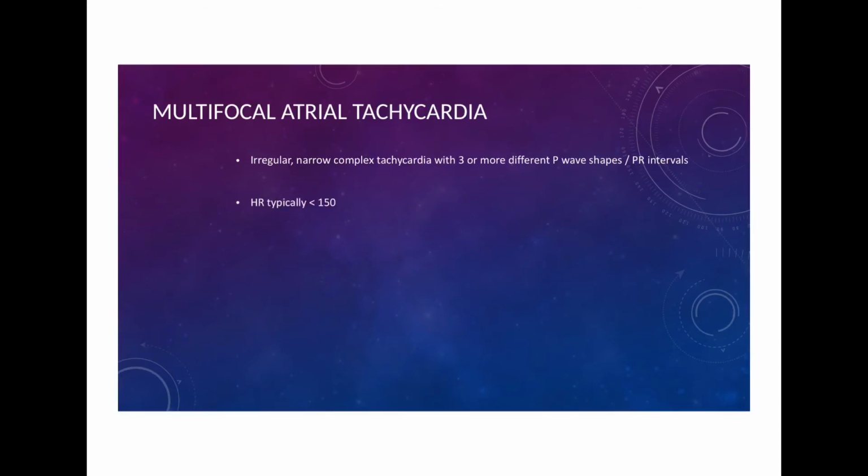Now there's multifocal atrial tachycardia, which, in addition to variable flutter and atrial fibrillation, is the other possible differential for an irregular rhythm. The key to identifying it is you're going to look for clear P waves, but they're going to have different morphologies alternating with each other. And it's really commonly associated with patients with lung disease, including pneumonias and COPD.